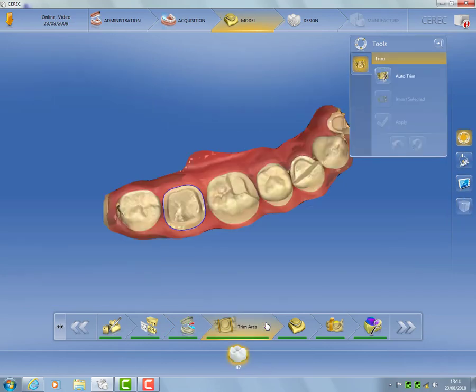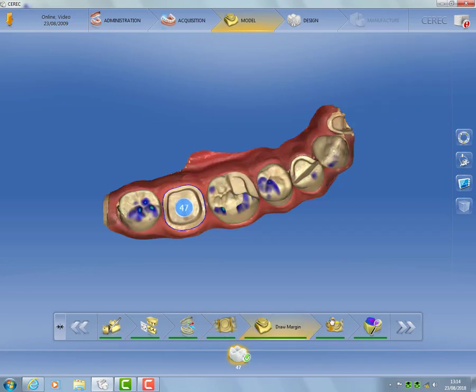than if all we do is, let's say, image the 3 distal molars. If you wanted to trim your case, you still can do that. Obviously that's going to come into play when we've got some proximal boxes and we're concerned about marking that margin interproximally. And then we have our margin step.